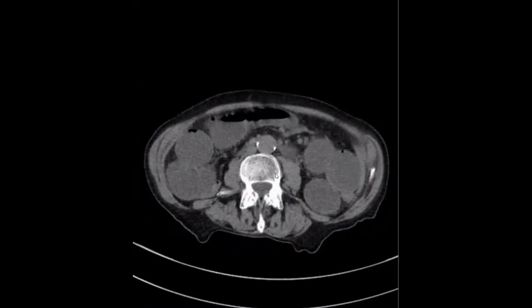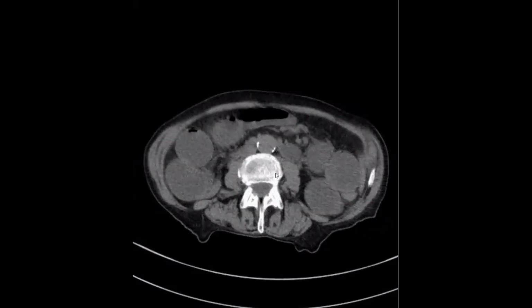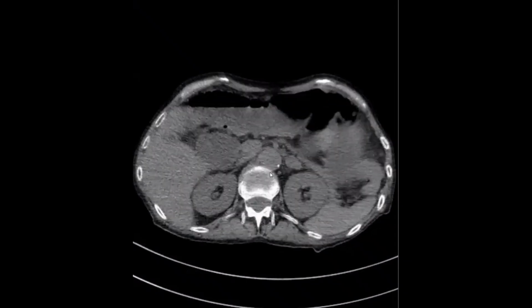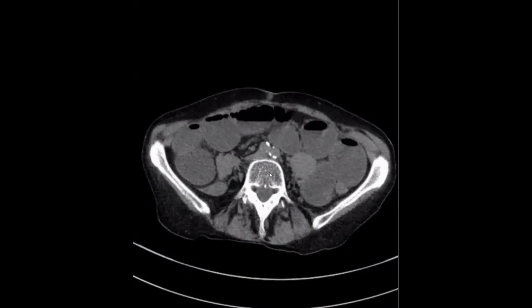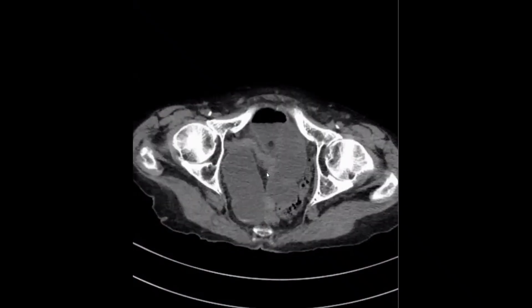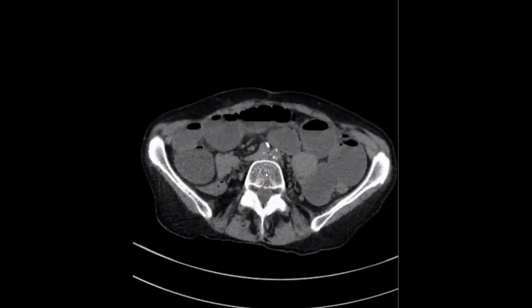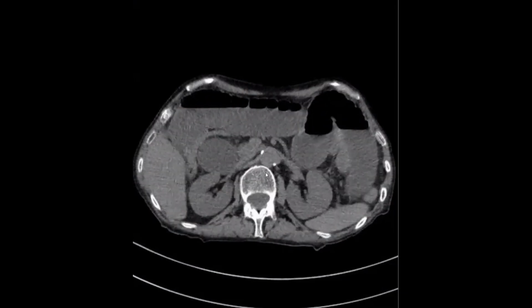The upstream bowel has a thickened, edematous wall. It could be due to inflammation or early strangulation, but there is no mural air within the herniated loops and no entrapped fluid. Checking with a contrast enhanced study to assess the wall enhancement would confirm or exclude strangulation. So you have a right obstructed obturator hernia with secondary small bowel obstruction. We don't have any pneumoperitoneum. And as you said, if the patient is prepared, we should inject IV contrast to check the viability of the bowel loops.